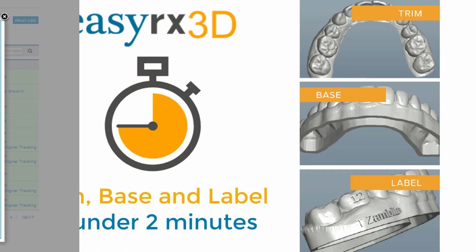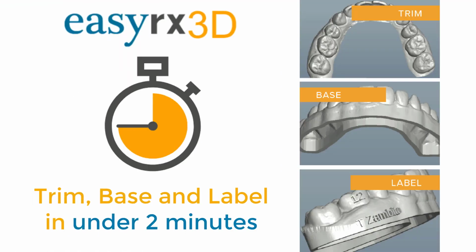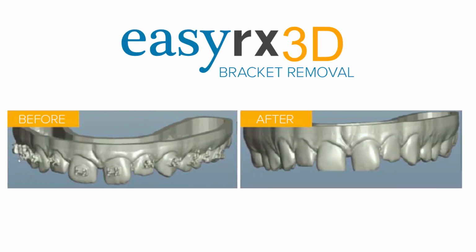EasyRx 3D provides you a fast, simple, and efficient solution to view and base digital models. You can trim, base, and label a model in under 2 minutes. Also in EasyRx 3D is EasyRx 3D Bracket Removal. This software allows you to digitally remove brackets from models.